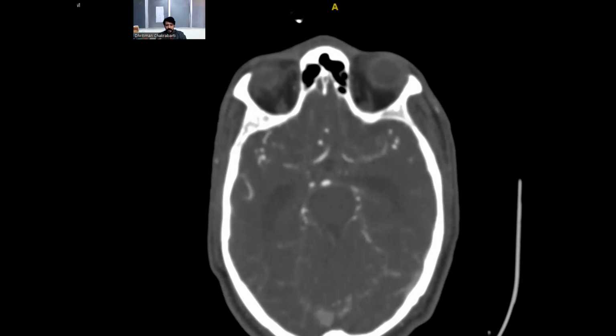Potential artery means that it is there, but it is not contributing much flow of blood. Because of that, most of the time your PCOM may not be visible even on angios, because it is a very thin and small artery. But in this case, you can see one side very clearly and the other side a little bit, in multiple segments like single dots.